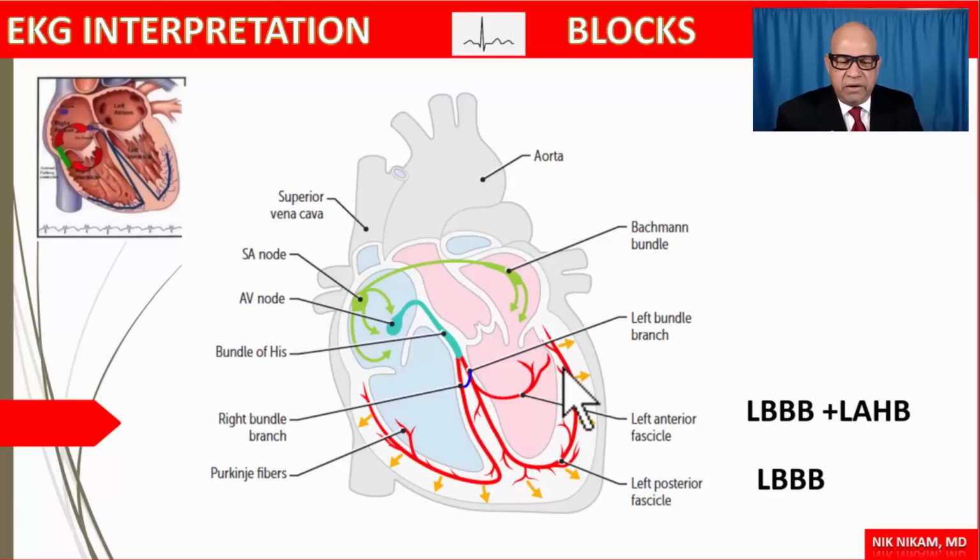So, if we have the septal involvement, we may not be able to diagnose the presence of anterior myocardial infarction. On the other hand, if we have a left bundle branch block which is involving the left anterior fascicle, we may have features of not only the left bundle branch block but also left anterior hemiblock, and we are going to look at some examples related to that.